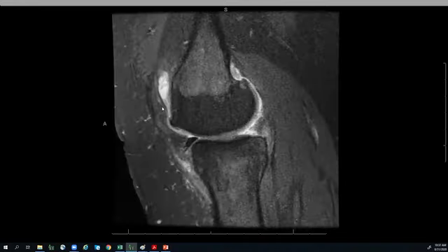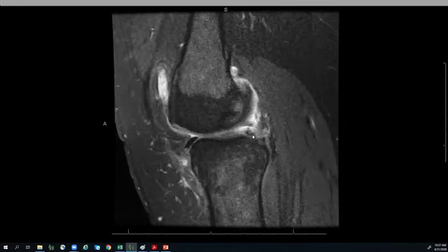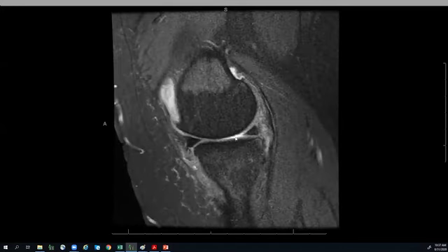It's a commonly missed tear by residents. But after a while, once you start reading a lot of knee MRI cases, you'll see that this tear is quite common and really should not be missed. The sequelae of such a tear leads to progressive osteoarthritis, sometimes even subchondral insufficiency fractures as a result of basically no more cushioning or shock absorber, particularly in osteoporotic patients. So that posterior root tear is another variant of the radial tear, basically.